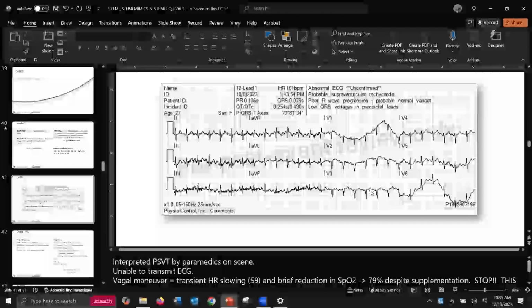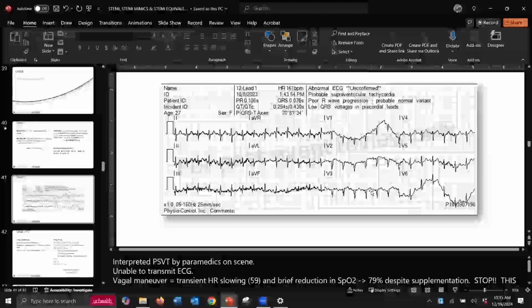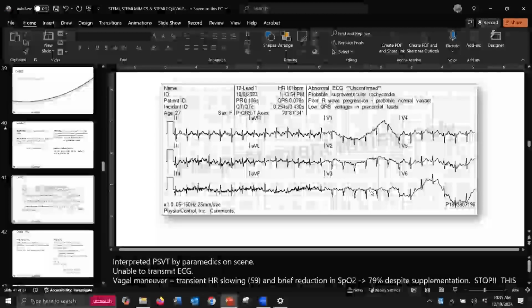Should we give her adenosine? Yeah, they did. I considered it. Yeah. She died. This is an ACLS kill. You have another one. Now, how do we rate control?